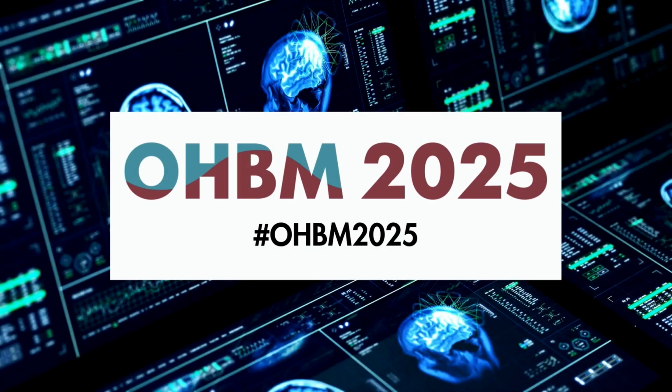Now we're going to do a bit of a practical session of do's and don'ts of TurboBrainVoyager. So this will be Amir and Ethan taking you through.